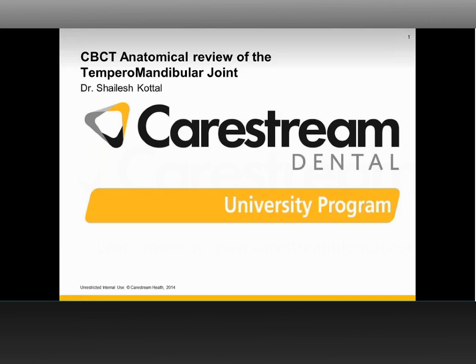I'd like to state before you get started, again, this is a cursory overview. This is not a full radiology read. This is not intended to serve as a complete overview of the scan. This is an anatomical review of the temporomandibular joint.